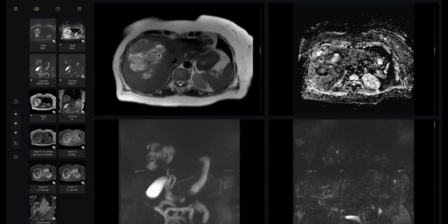Okay, but there is still one buzzword. What is the content that makes the pus? What is the nature of pus? Is it water or something else? Maybe another component rather than water, like high protein and low sugar.